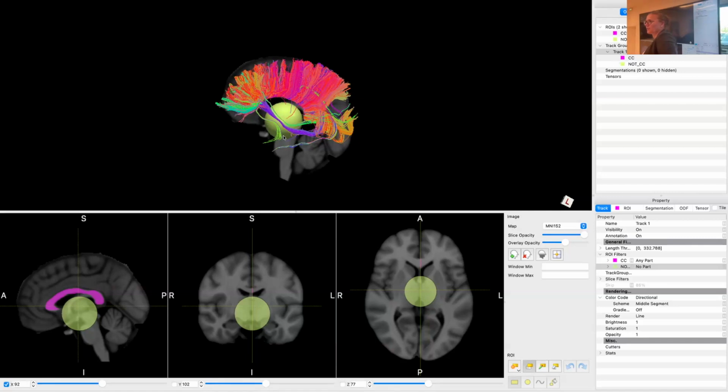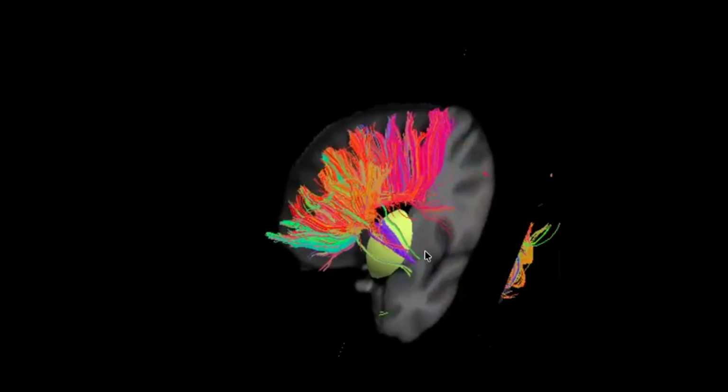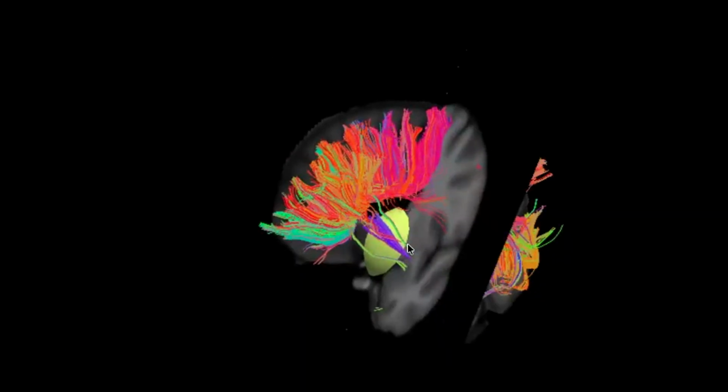If you have them as well, you can do that with me. And perpendicular means we're going to bring this one back so I can see when I catch them all. And now you can see that I'm piercing through the coronal slice here. Okay, right here.